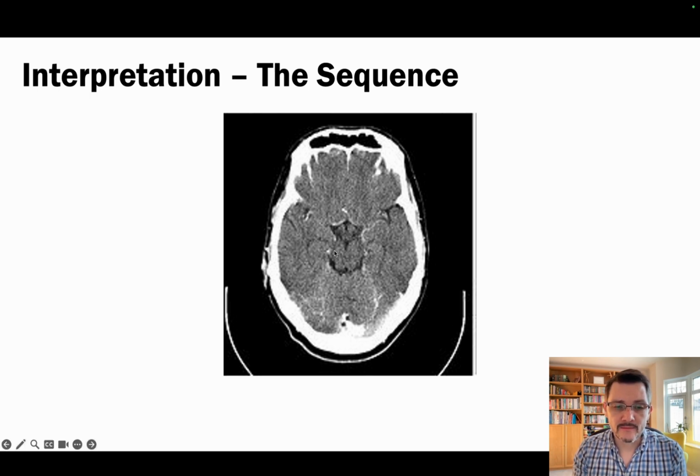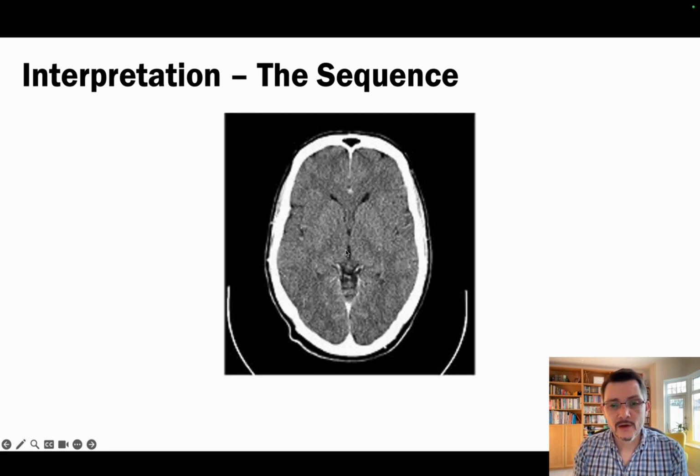The brainstem area is all starting to disappear at this stage, so what you'd imagine here is the more healthy brain tissue coming in. The more traditional cerebrum coming in from both sides. We've got the start of the ventricle. You can start to see the C shape of the lateral ventricle on the right hand side and on the left hand side as well.